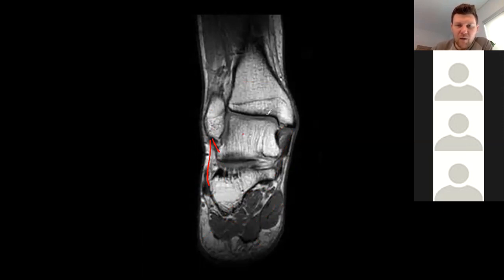What I do want to point out is when we're looking in the joint, so you see this white bone, I drew it on the remnant there, all this white bone there. What kind of bone is that? What generalized type of bone is all this white bone? Oh, cancellous. Yeah, good. And then what about this black line right there? The cortex. And then what do you think this gray is? The subchondral.